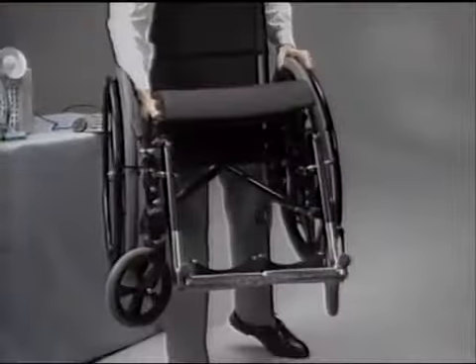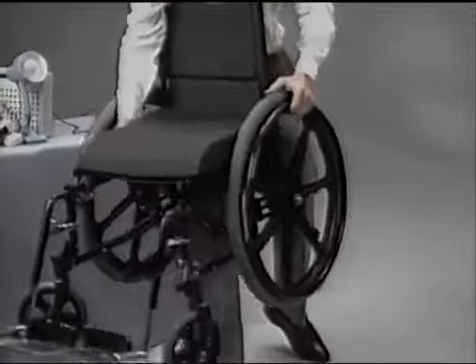Well, individuals who are going to be spending their entire day in a wheelchair want to have a wheelchair that makes them feel good about themselves. I found children who have a choice in the color of the wheelchairs they are going to be sitting in start to enjoy the wheelchair a lot more. I worked with a girl not too long ago who chose hot pink as her choice of wheelchair. Now, this one is a black wheelchair. It's called an ultralight wheelchair because it does one thing that's very nice. It's very lightweight and easy to pick up.